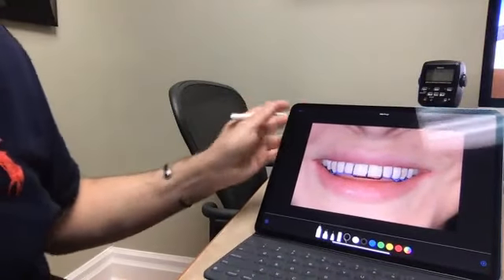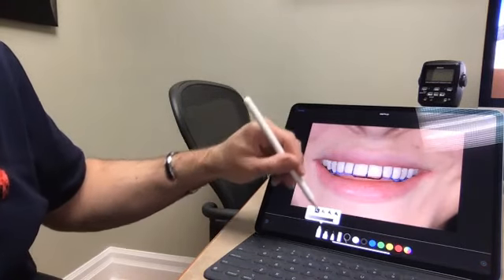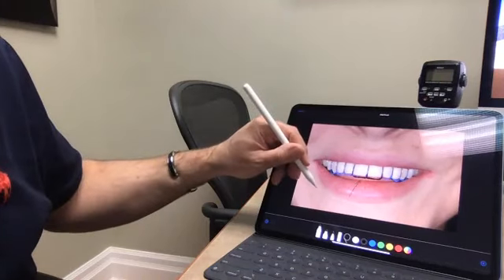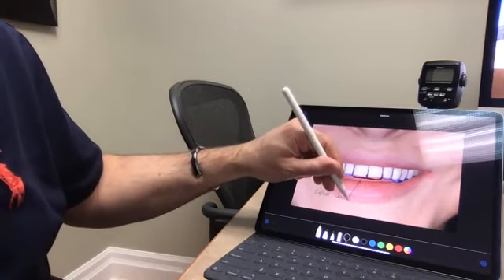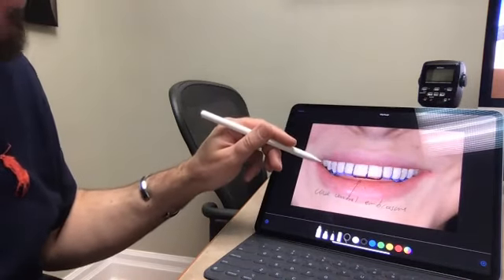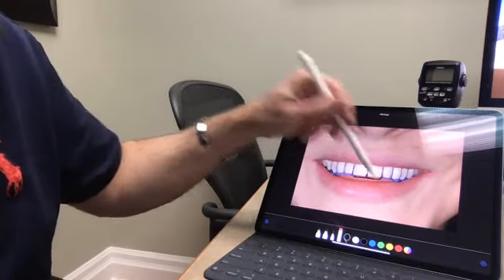It's a starting point. So this just gives us an interactive starting point for the smile design for you and the patient. And then you could even add notes to this. So say the patient would like to say whatever they'd like. You can add an arrow and add a note. Close central embrasure. And this all can now be sent to the ceramist as a really detailed image of where you'd like to go with the case with the wax up.